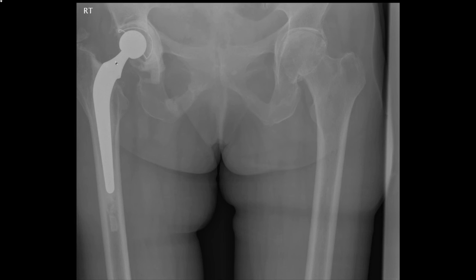She did, however, have pain on the right when standing, and they were convinced there was a fracture. So, as before, look at the pubic rami. Superior pubic ramus, superior pubic ramus. Inferior pubic ramus, inferior pubic ramus. And there is an abnormality here. There's a sclerotic area, there's a lucent line, and there's another lucent line there. So as previously said, if you have a ring, it nearly always fractures in two places.